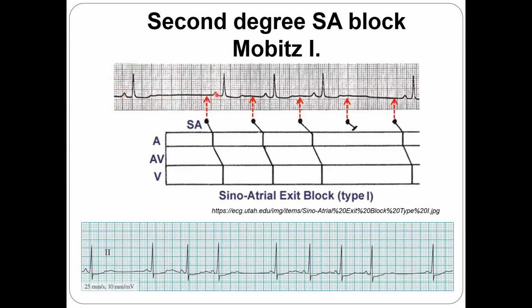And after that you do have a P wave, and P wave, and P wave, and P. Now, what you have to do, basically, is look at the last conducted beat and the first conducted beat, and look at whether this is twice as much or not, that's when you do see the PP interval.